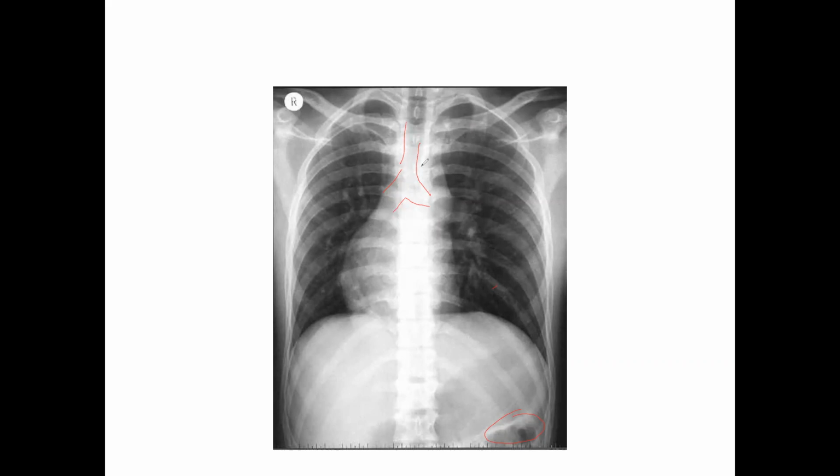We've also got the aortic arch that can be seen coming up off of the heart in that area. This particular patient has what would be referred to as dextrocardia. That's where you get malrotation, or where the heart's turning the opposite side. So, typically you should see the apex of the heart pointing down toward the lower left portion of the patient, but this one happens to be pointing the opposite direction.